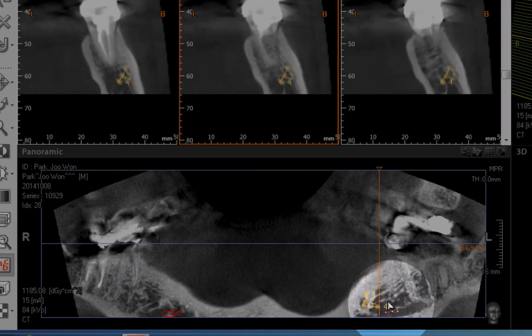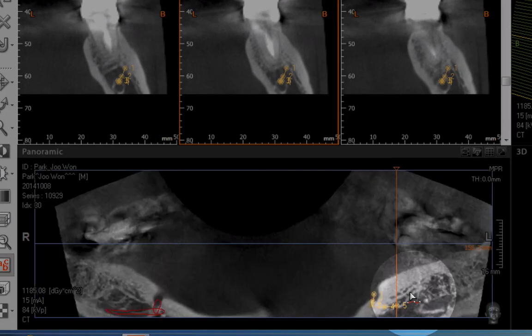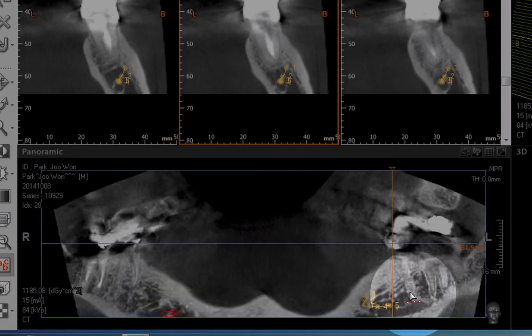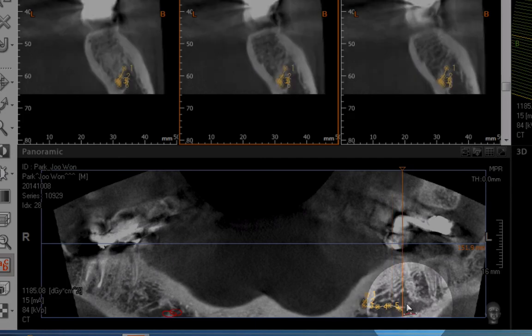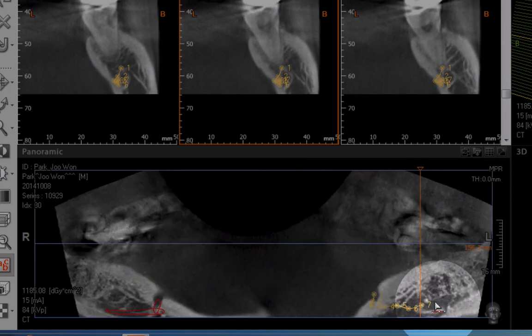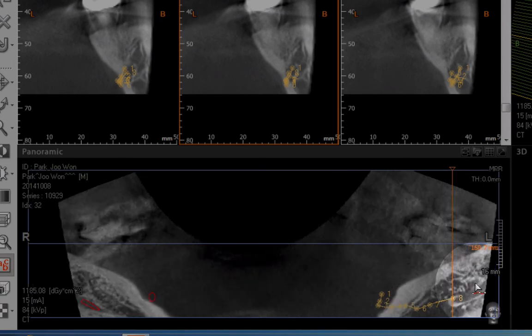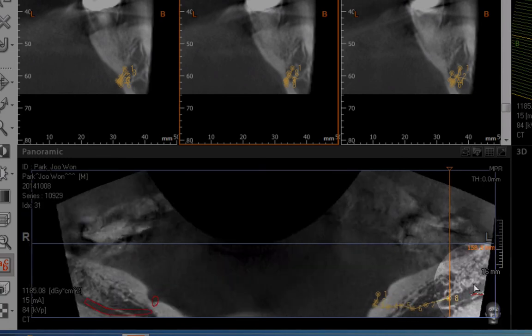Here, here, oh, I'm actually a little high, so I'm going to go here, here, here, and double click right here.